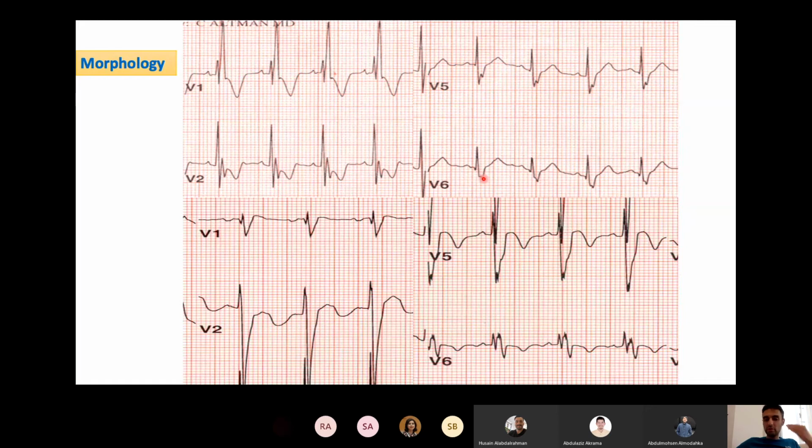Of course, left bundle branch block you see more in adults. Right bundle branch block is usually secondary to cardiac repair, and hence this is why you see it often in pediatrics. Left bundle is more ischemia, and we don't see as much ischemia in pediatrics. So focus on right bundle branch block, and this is how it looks like.